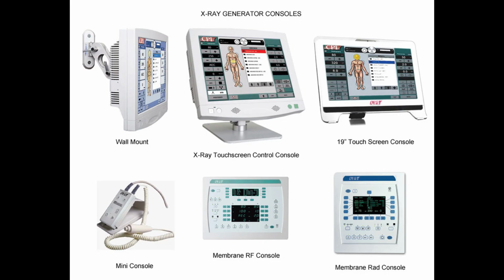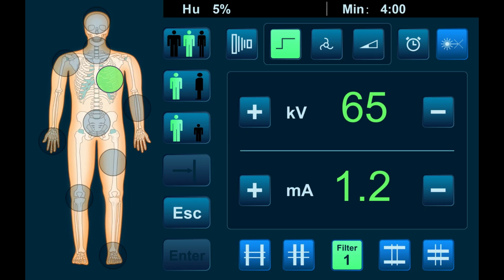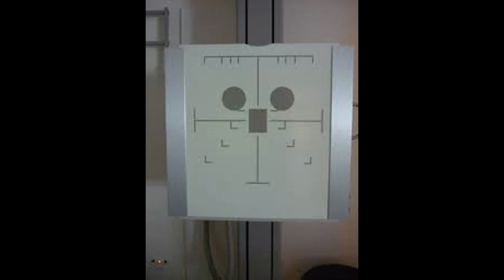9. Exposure System plus Automatic Exposure Control, AEC. Exposure System. The exposure system includes the console and circuits that send the exposure command and set the kV, mA, and time parameters.